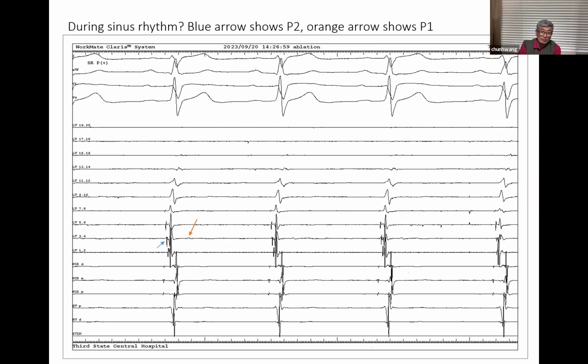Well, it has to be sharper. Yes, it's low frequency, and then it's wide, and it's a little far. What do you think is happening at that particular timing? Draw the line to the T wave from there. T wave, all the way up, straight up. It's the onset of the T wave. What is happening at the onset of a T wave in your heart?